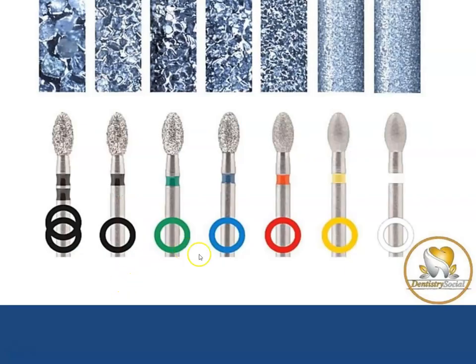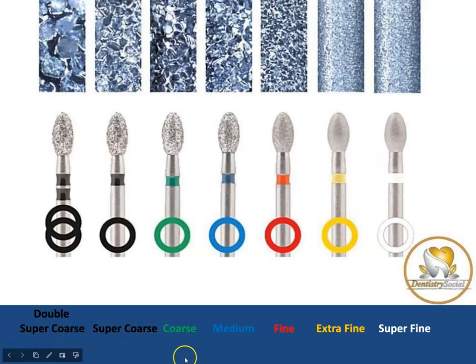Here's a picture showing you the white, the yellow, the red, the blue, the green, the black, and the double black. All they mean is the type of diamond size that was attached to it. Now if you look at it, this one has a double ring, so it's a double super coarse. Black is super coarse, and you can take a picture of this and try to memorize it. These colors are standard to dentistry, and we'll cover in other videos other things that have the same exact pattern.